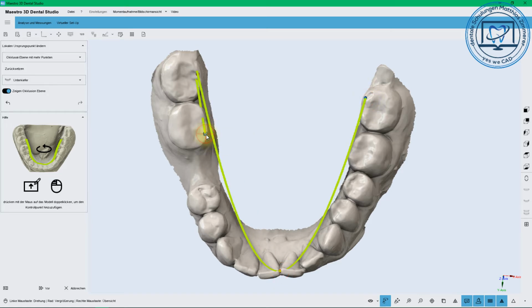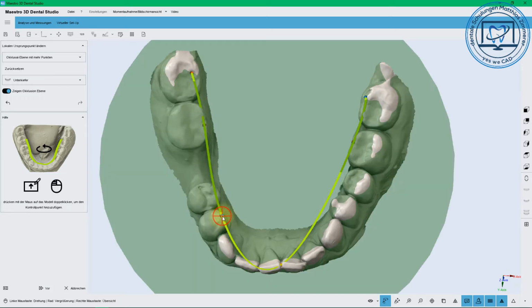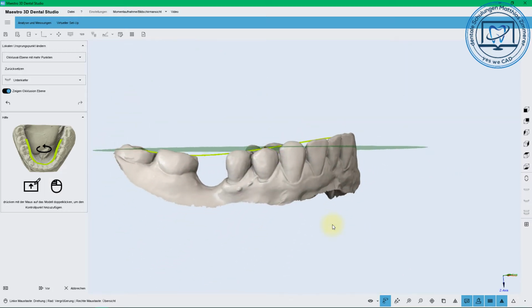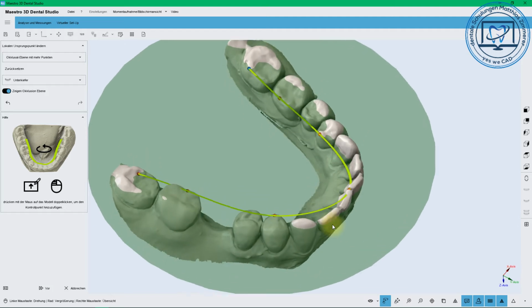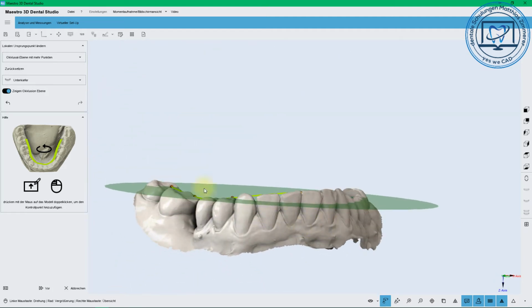It's possible to make it this way, but it would probably be better to set the points one after another, and then you can set new points in between. More work for you, but I don't think it gives a better result.